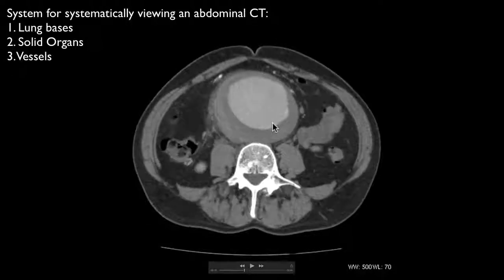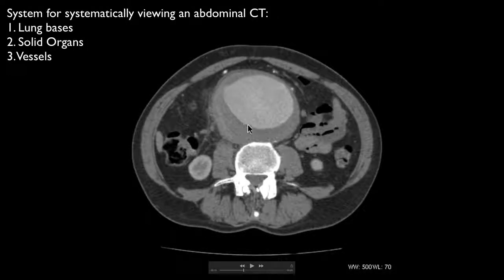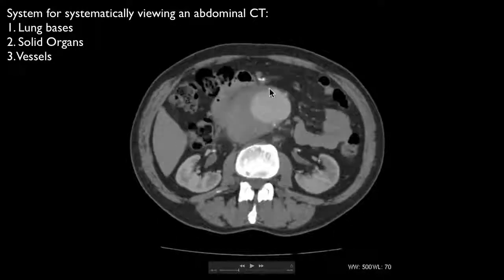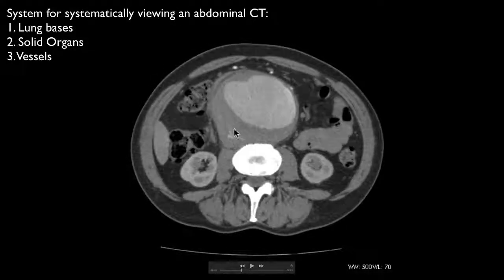Quite often, well, almost always within abdominal aortic aneurysms, you'll have areas of thrombus, and that in itself is a normal finding. This has got quite a big flow lumen. You can see all this contrast here, blood flowing through, but there is stuff outside the aorta as well.